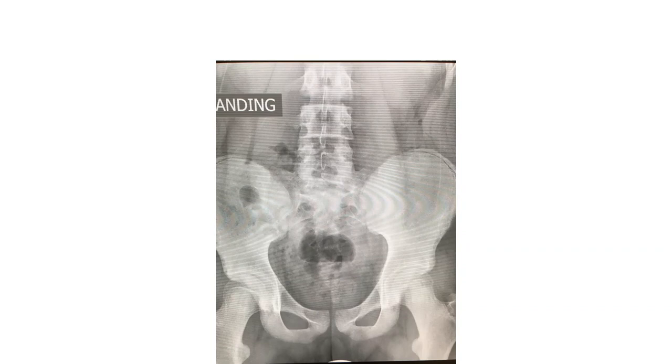Well, I'll give you some more descriptors, okay? The proximal femoral physes appear closed. The hip is well covered. The triradiate cartilage, which is a growth plate here, is closed, okay? So you can describe what you see. So when someone asks you about an X-ray, you want to describe what you see and think about how it applies to your patient, because you're going to correlate this with your physical examination, okay?